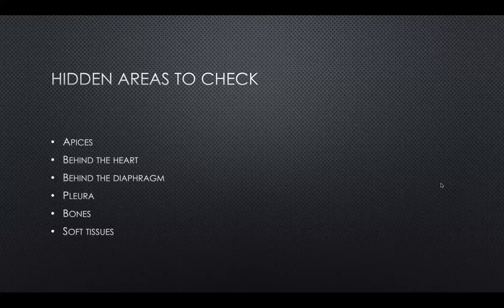It's important to look at bones because there's a lot of bones on the chest X-ray, and there's so much that can be picked up. So if you've got a patient with subtle metastases on the bones, that's already giving you a lot of information. Have they got multiple rib fractures? Is it a flail chest?